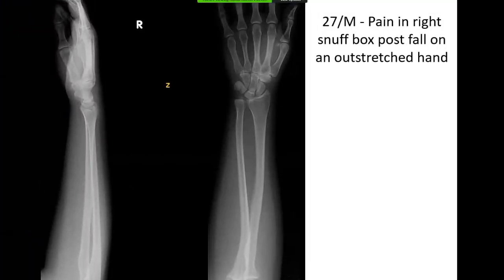I'm presented with X-ray frontal and lateral projections of the forearm, hand, and wrist. In the given images, the history is that of a fall on an outstretched hand. I'm able to appreciate that there appears to be a lucent line in the scaphoid, which has no cortical margination, resulting in a cortical break, giving the suspicion of a fracture of the scaphoid.